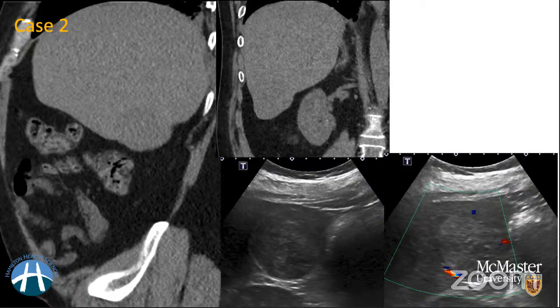But in terms of the malignant spectrum, you should always remember that it can be a lesion which is mimicking something benign, but it can be colorectal carcinoma metastases or a treated metastasis from breast carcinoma. Then there can be metastases from RCC, thyroid, melanoma. So basically any tumor which can be hypervascular may have this echogenic kind of appearance on ultrasound.